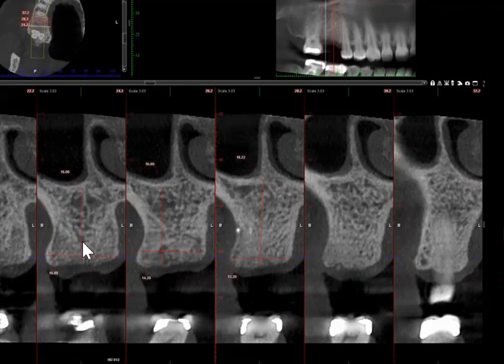But again, that 16 is extremely high in my opinion. And again, here, which is closer to the center of the edentulous ridge, height being 18 millimeters is very, very impressive. And that is even more surprising, the fact that this is a scan from a female patient.